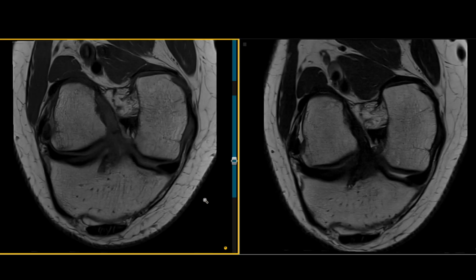These are two MRIs, double oblique sequences following bracing, demonstrating an ACL that is healed, but the one on the left is of higher signal intensity as compared to the one on the right. And the signal intensity is largely being compared with the signal intensity of the PCL.